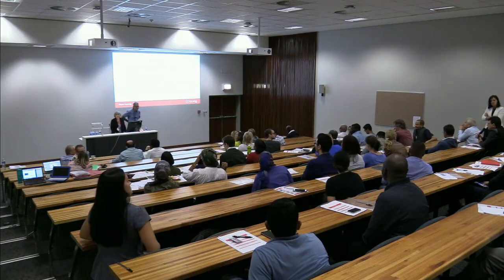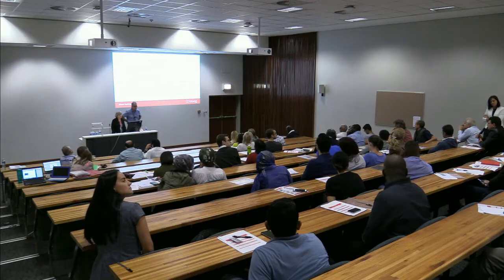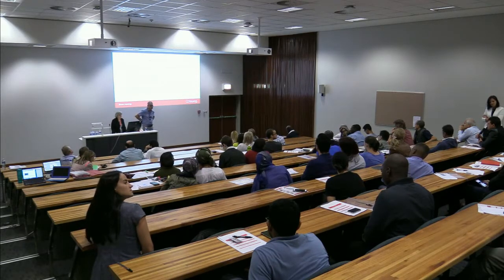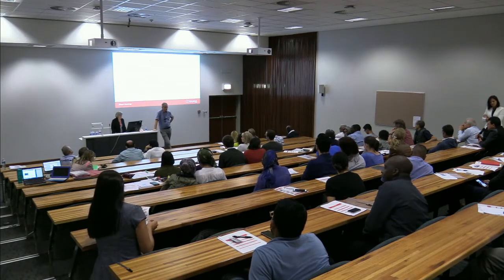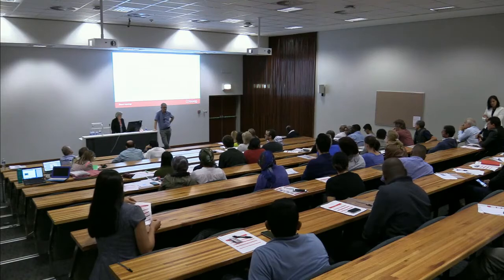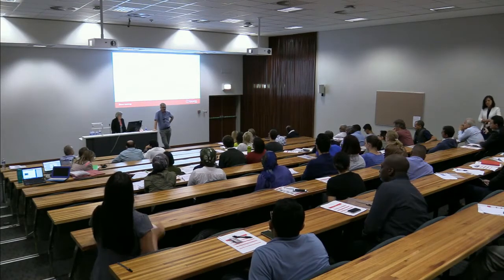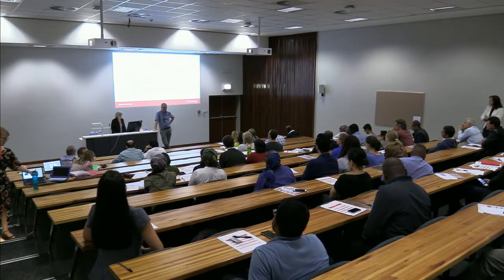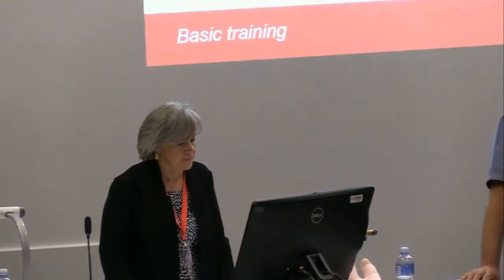Looking at a fetal spine in a longitudinal view is always the easy one, the intact skin and looking at the intact vertebra. The axial one is the one that I find difficult. How important is it to accurately look at a spine in the axial view when you have a normal longitudinal view? No, the axial view of the spine is actually a cop-out if you don't see the spine in a longitudinal view.